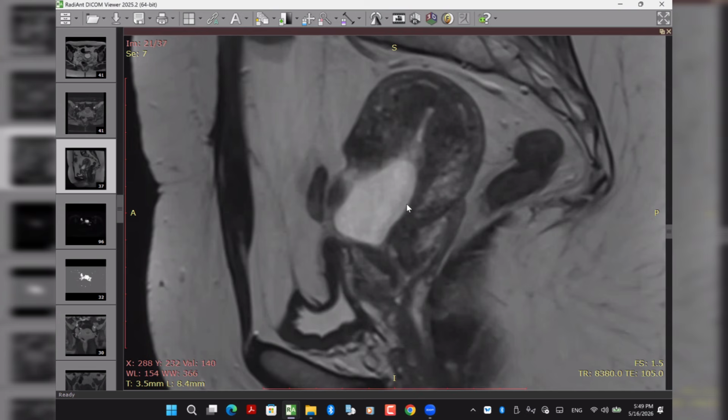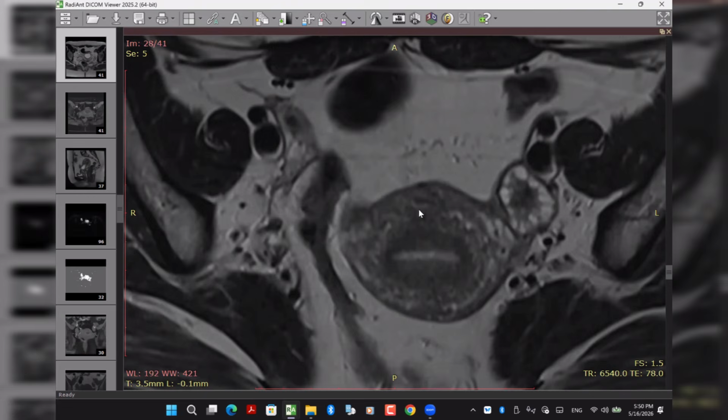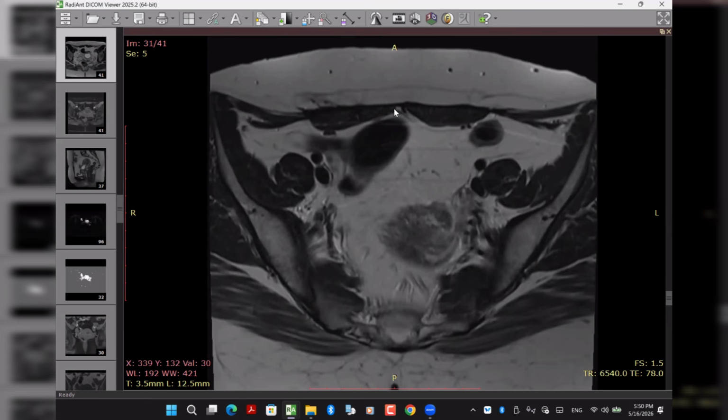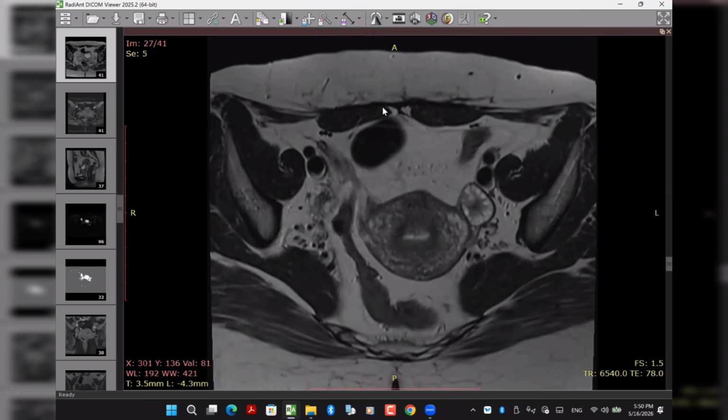Let me discuss this case with you. So we have an abnormal cystic lesion in the lower uterine segment, mainly at the anterior segment, on top of the markedly attenuated previous cesarean section scar. You asked me if she had any previous history. You don't need to ask. Just look at the anterior abdominal wall at the presumed site of the scar. Before asking, we check the rectus.